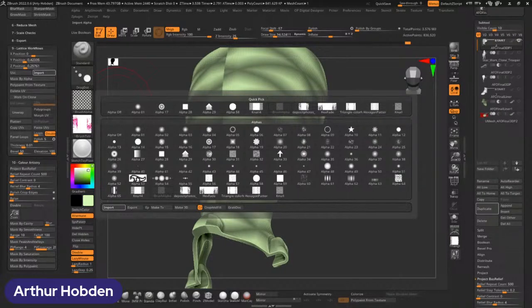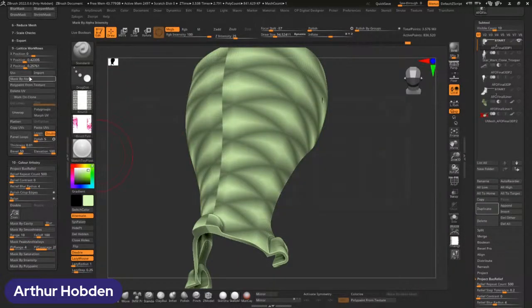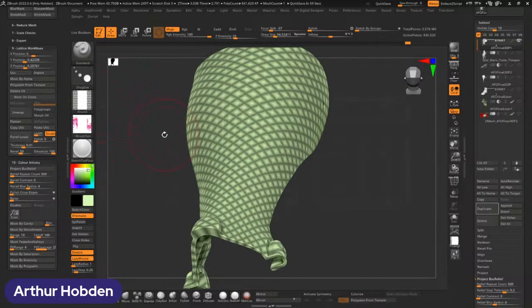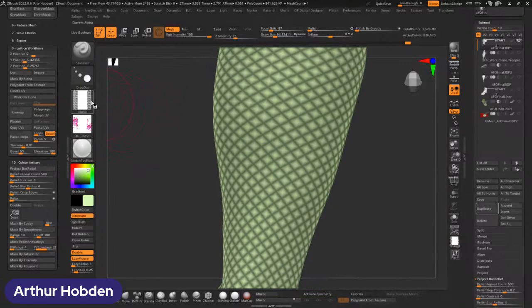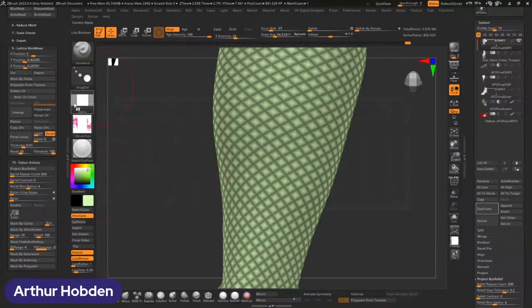So I'm going to go to the next one, which was knurl 2 and knurl 3 and knurl 4. Knurl 3 changed that proportion a lot. We bunched it in a bunch. So you can see it's a much bigger grid. If we mask this one by alpha, it's like, oh, okay, that's really nice. It's much better. So I had to change the proportions by mapping it differently. And especially when you do hexagons or something like this, they smear, so you've got to be careful.